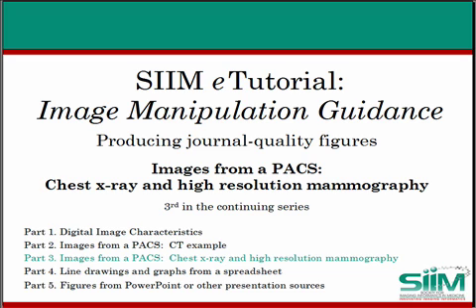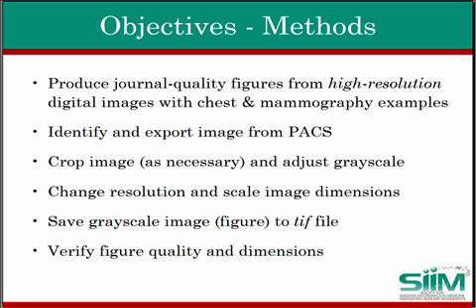In this tutorial, images from a PACS representing a large field of view chest X-ray and a high-resolution digital mammogram are demonstrated, with recommendations in converting them to standard file output with the resolution and dimensions required by a scientific journal. A large field of view chest X-ray and a high-resolution digital mammography image represent two extreme examples of image content for figures.